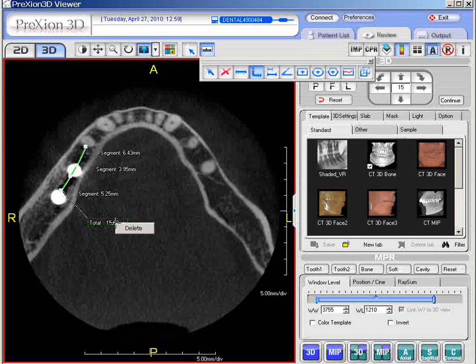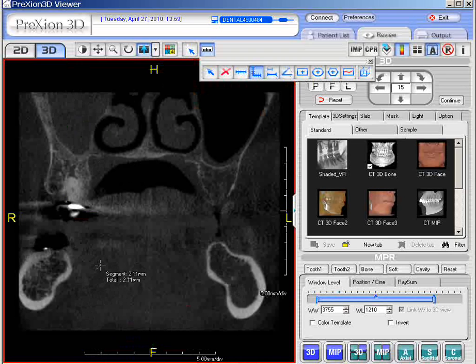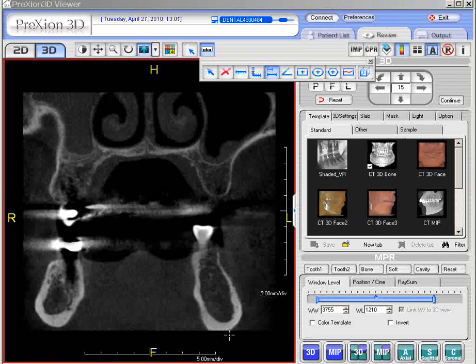So to delete it, right click it, and you're able to delete it very quickly. Now, for the next one, I probably won't use this very much, but we are going to show you its feature for measuring relative length. Relative length is simply if you want to measure in a comparison, just in a percentage.